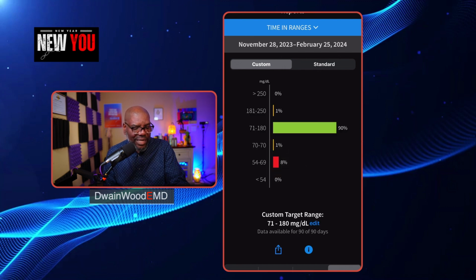So over the last 90 days, I've been in target 90% of the time. 8% of the time I've been low, and that's probably during the time when I was fasting. If you guys have been watching, you know that that's what we've been doing. And then 1% have been in the 181 to 250, and that was probably when I was in Jamaica. If you guys remember, I ate some patties and drank some coconut water, and my blood sugar spiked up.